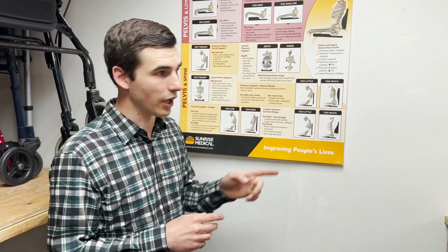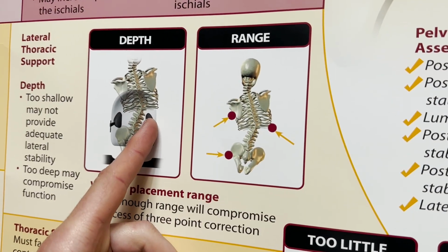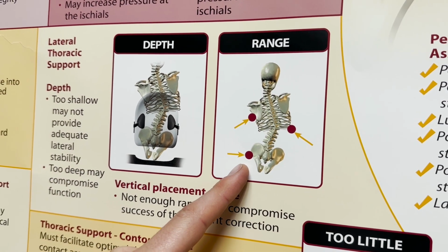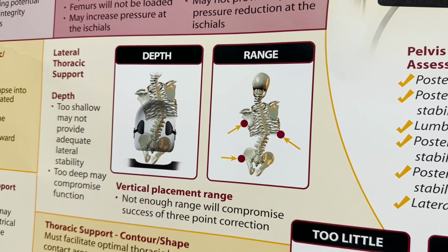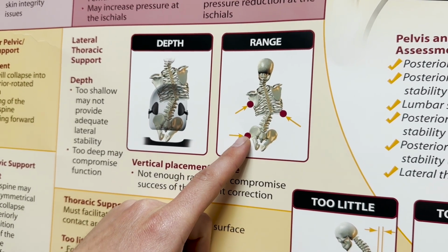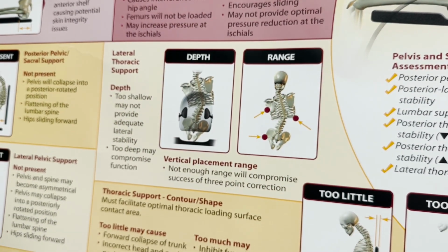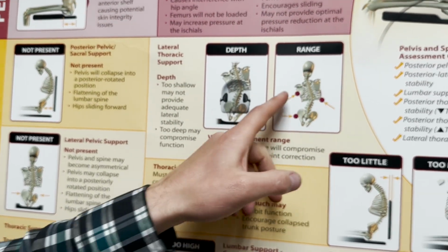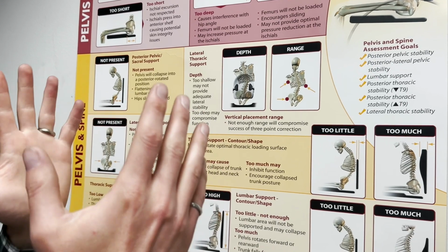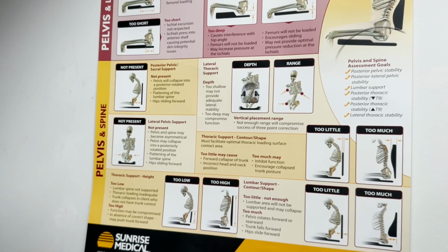If we're trying to modify for that, an example here is if we have scoliosis. We're going to be adding laterals, not just randomly on the sides for support anymore, but we're adding them to actually try and guide the spine and its growth. This is particularly effective in the younger years. The older you get, the stiffer you are, not as much flexibility there. These laterals being put in are not put in like a vice. We're not trying to squeeze and crush that spine. If we do that, we'll create nice big pressure sores on the ribs, and that'll be very uncomfortable. But we want to put enough pressure support that as they grow and as they sit into it, the bones will shift and change to the direction that we're desiring them to go.